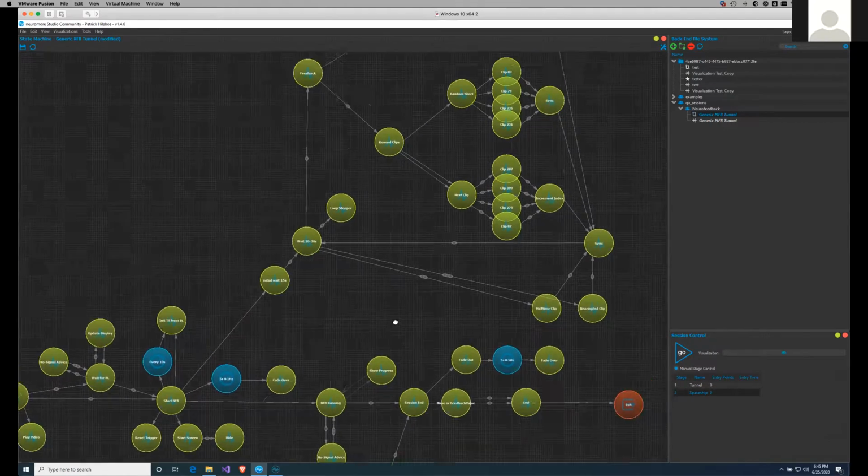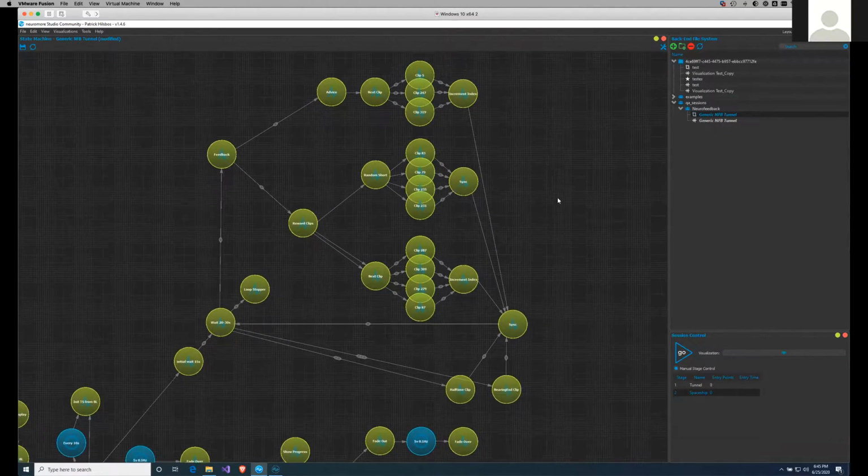Additionally, we also have that section up here. What it does is, every 20 to 30 seconds, it looks at how well the user is currently doing. And we have two possibilities. Either the user is doing pretty well, and then we randomly play one of those reward audio clips. And you will hear them. Oh, you're doing good. Yeah, continue like that. You're getting more and more focused, and so on. Or if we realize that during the session the user is really struggling, then we play some advice.